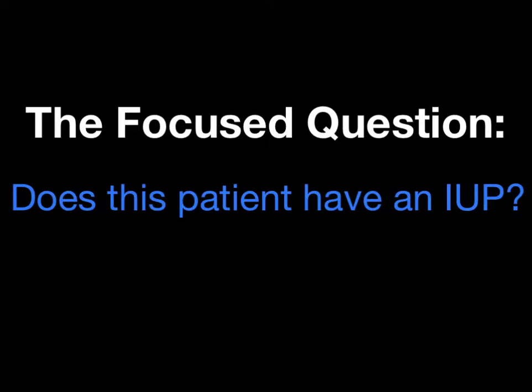The focus question we're going to be trying to answer here is, does this patient have an intrauterine pregnancy? So we're going to be concentrating on the findings within the uterus here, both transabdominal and transvaginal. We're not going to be spending time on how to evaluate the adnexa, since this requires a greater degree of skill, and it's not realistic that someone who has had a 1-hour lecture and has done only several hands-on first trimester exams would be able to accurately evaluate the adnexa. So we're going to be sticking with the findings within the uterus.